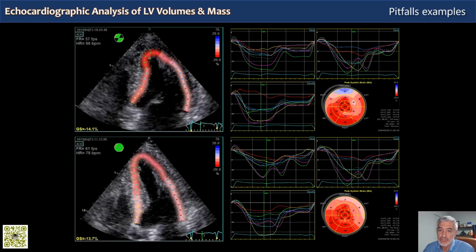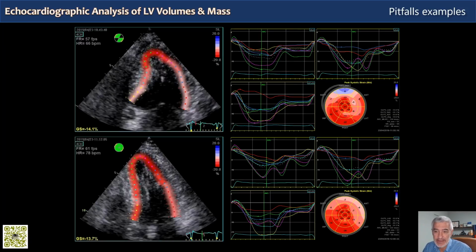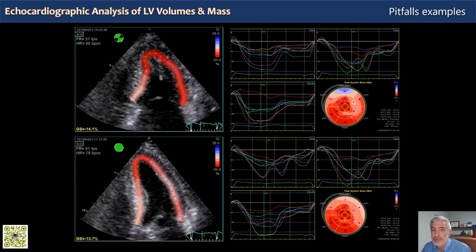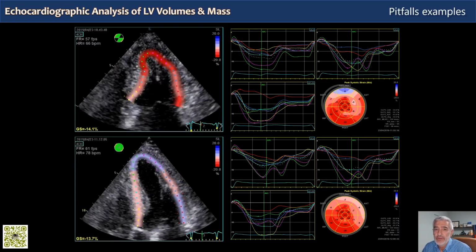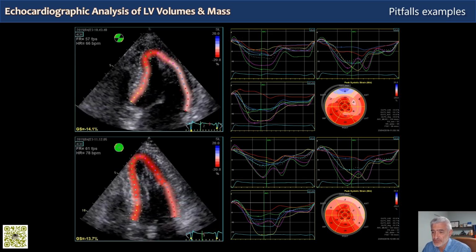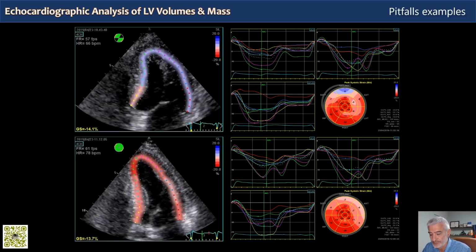This geometry issue stresses 2 points. First, left ventricular foreshortening makes the exam inaccurate, since left ventricular volumes, systolic function, the ejection fraction, the strain, and also the evaluation of valvular regurgitations are all affected. And 2, the operator that is not aware of this issue and produces incorrect images and incorrect volume and ejection fraction, as we have seen, is an unreliable operator, which makes the whole exam unreliable.